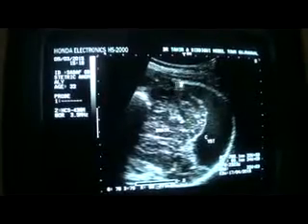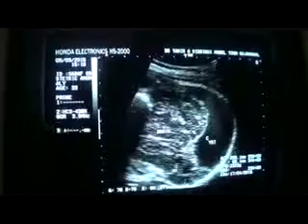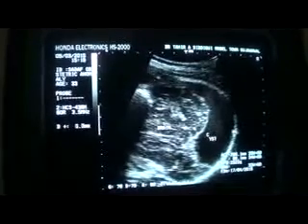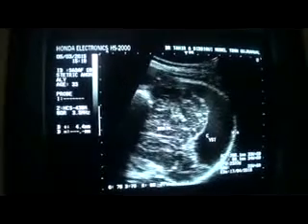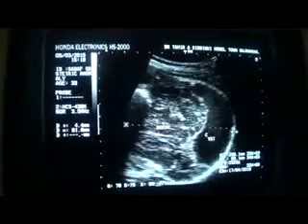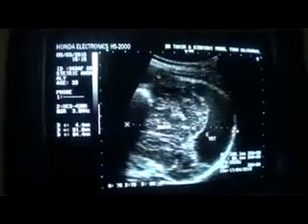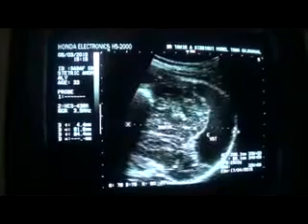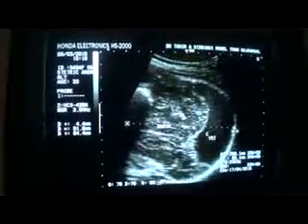And this is the outer lining of this cystic structure, and it is a thick wall, measuring 4.4, whereas the approximate measurement of this cystic area with protrusion of the brain tissue within it is 9.1 into 8.4 centimeters, and this is consistent with meningoencephalocele.